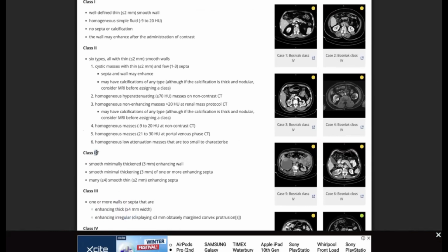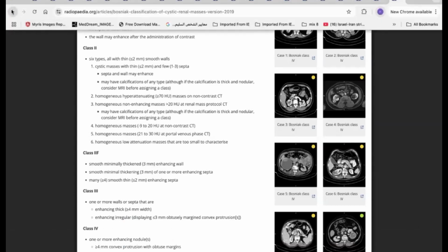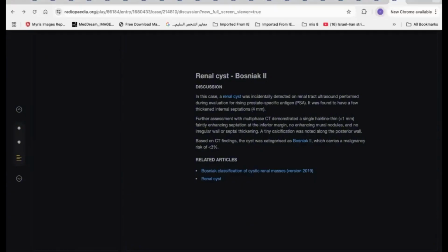Don't even confuse yourself with type 2F. No problem. In the exam situation, really everything gets distracted in your brain, so keeping the confusing information as a very simple and clear buzzword will never confuse you. Okay, my colleague, is this clear? I think clear. Next candidate.